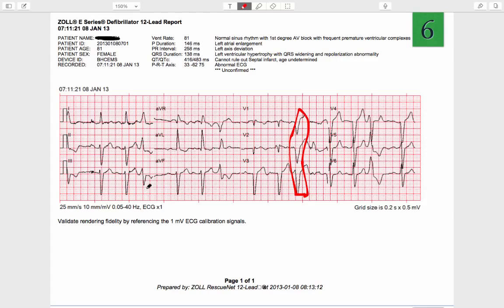And that is a PVC. So there are extra beats, but when we have a normal beat, it looks like there's a P wave for each of those. For the most part, there's an extra beat from a different focus. Well, potentially not a different focus because it changed leads. So at any rate, there are premature complexes.